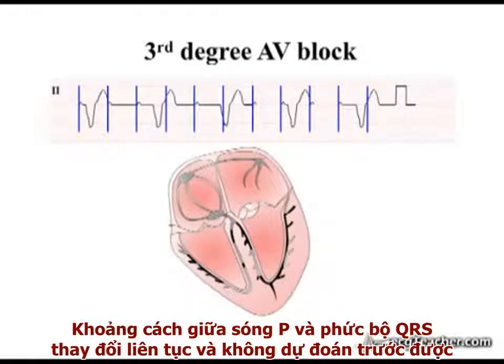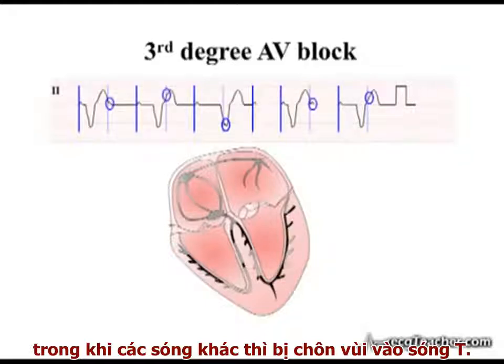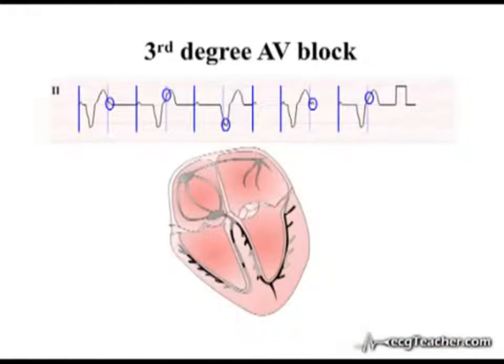The distance between P waves and QRS complexes varies continuously, and some P waves are buried in components of the QRS complexes, while others are fused with the T waves.